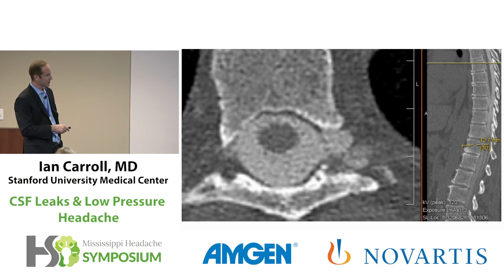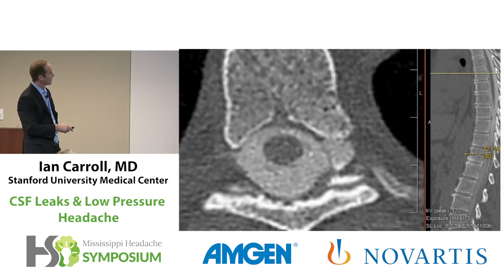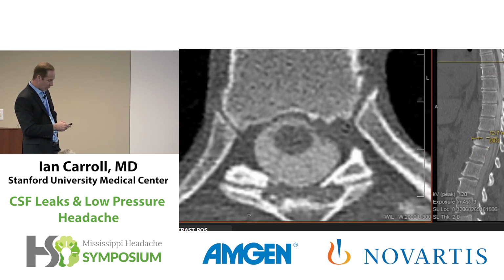This is the most suspicious place because you've got the known structure that can leak. It's big. And then you've got some poorly defined borders where the contrast is not just up against the border and has a sharp border. Another cut in just a couple of millimeters away. Again, this was read by our radiographers as suspicious for a leak. And right below it, possibly giving rise to this, is a disc with a little calcium spike, again, coming in towards the thecal sac.